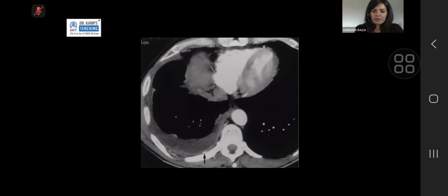If the primary question is underlying pleural disease, benign or malignant, you need to do a 60-second delay CT scan with contrast, because that is the optimal time for enhancement of pleura, whether that's chronic inflammation, active inflammation, metastatic involvement, nodularity, or primary mesothelioma. Either way, 60 seconds is the magic number.